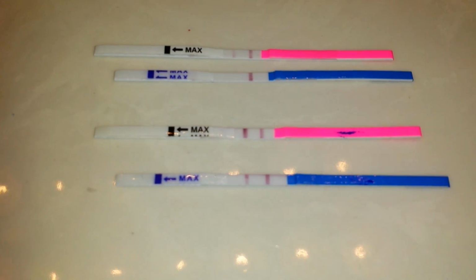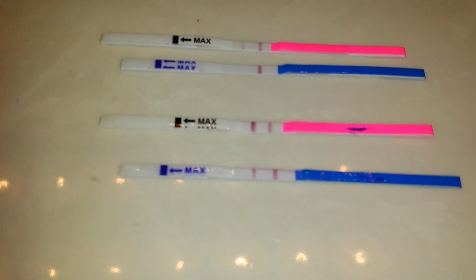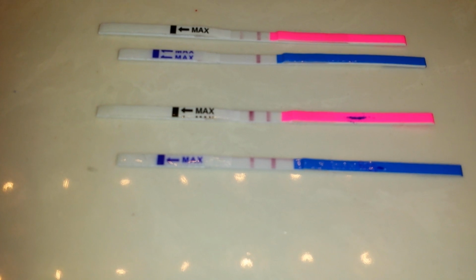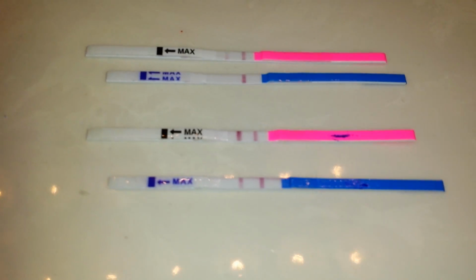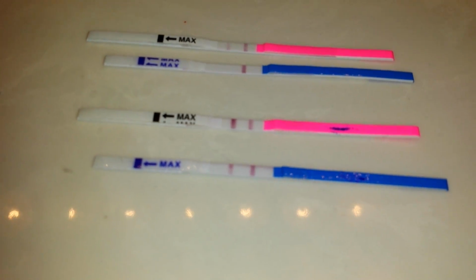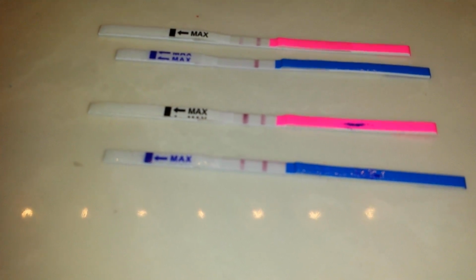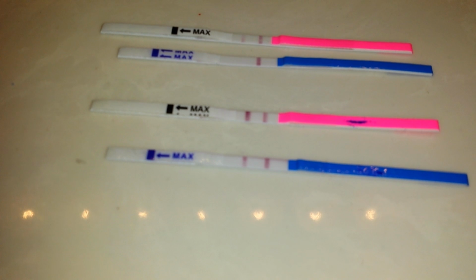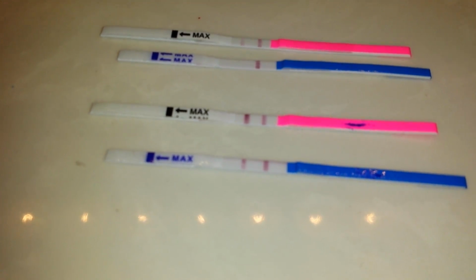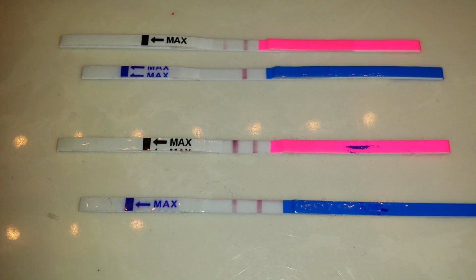So with that being said, I think you would have better results if you just simply tested with a pregnancy test. But if you enjoy peeing on a stick, this very well could be an indication that you may possibly be pregnant, if you know for a fact you don't have PCOS or anything that would elevate your levels of LH. So there you have it. Look how dark the test line got compared to the reference line or the control line.